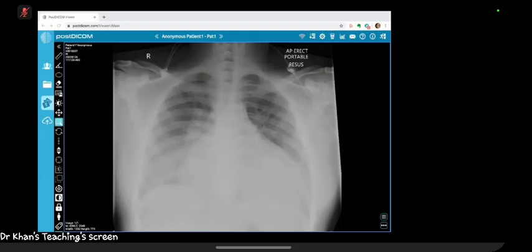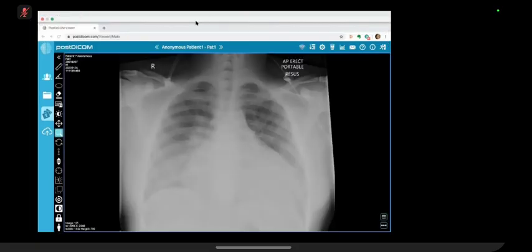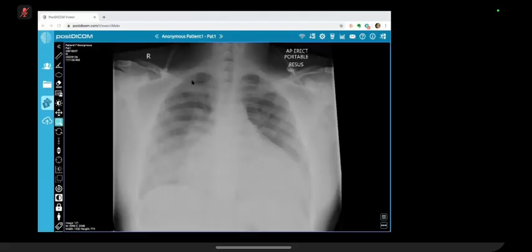So this is a frontal chest X-ray in an adult patient demonstrating cardiomegaly with generalized enlargement of the heart. There is airspace opacification involving the right hemithorax, predominantly in the lower and mid zones. The costophrenic angles, I can just make out on both sides.